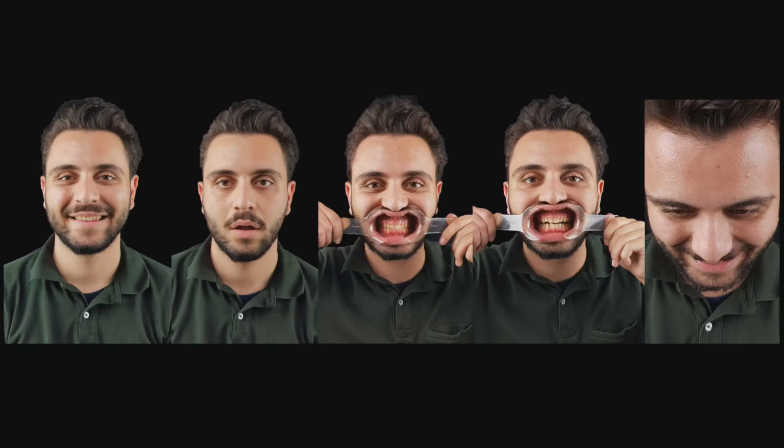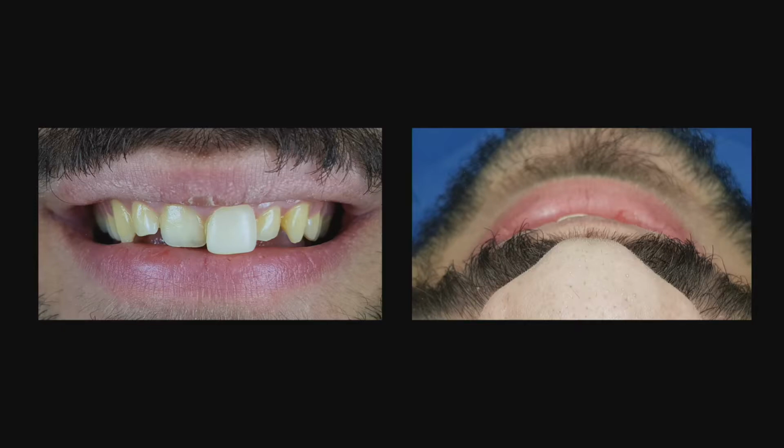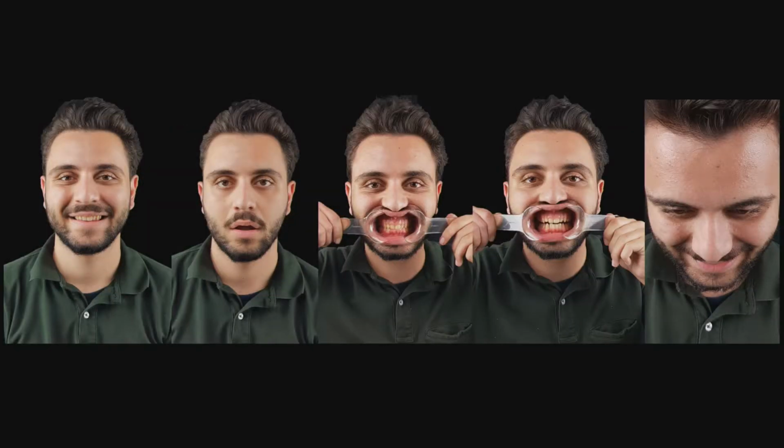So to summarize the case, as we see now, can you see the picture of the case? Dr. Iliev took 5 pictures, and then corrected one central by adding on the buccal surface, so that now you can see the vestibular part of the tooth. Because if you go back and look at the 12th position, the last one, you cannot see the central.